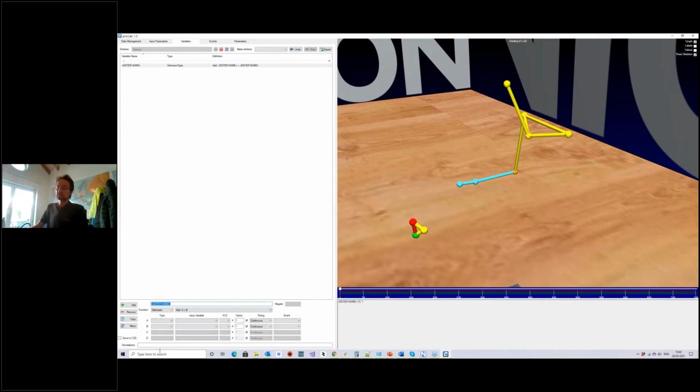Needless to say, I've done this already, and I've even practiced a bit. So I'm going to start diving into these calculations. The idea here is that I'm going to show you what's possible, and I'm not going to explain in great detail why exactly I've done it in this particular way.